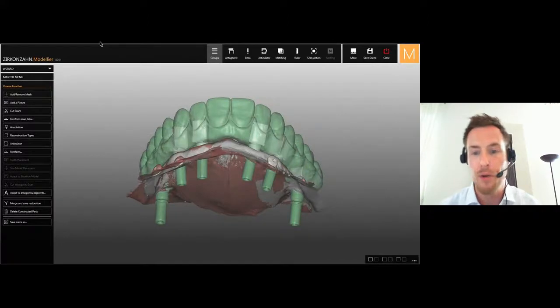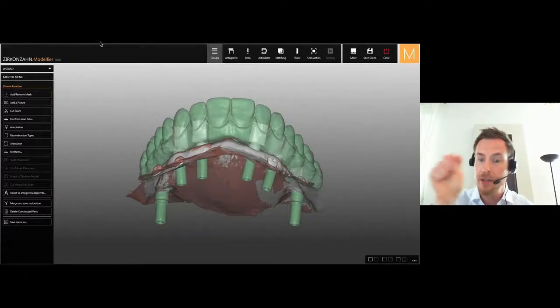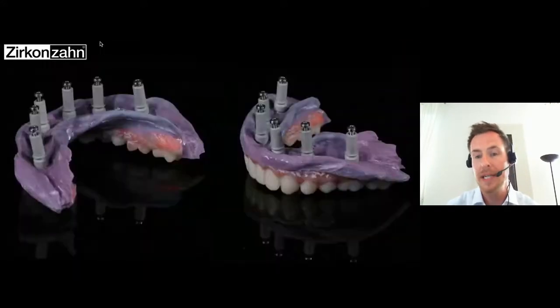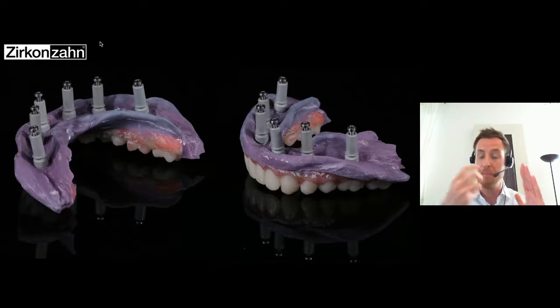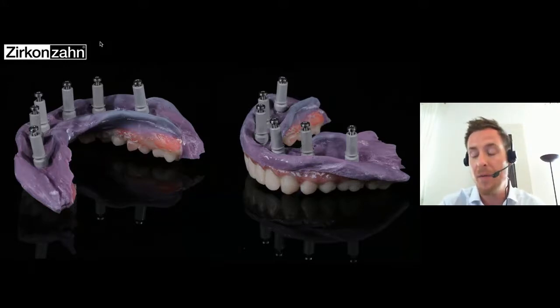The fourth type of scan flags is the little pieces you can see under the reconstruction. Those scan flags are called scan analogs. The scan analogs are quite nice because you can screw them onto the impression coping in a physical impression and scan the whole impression with a scanner.